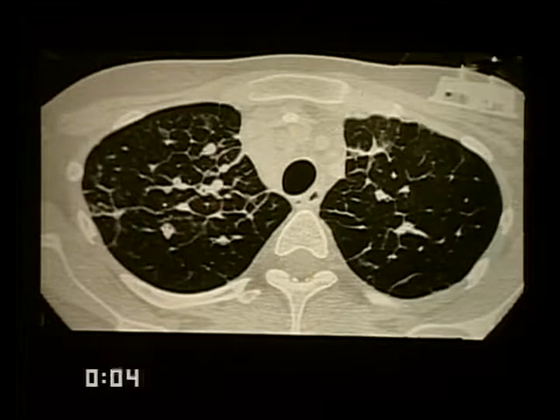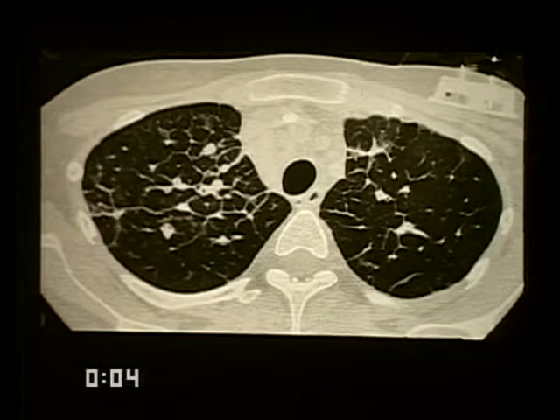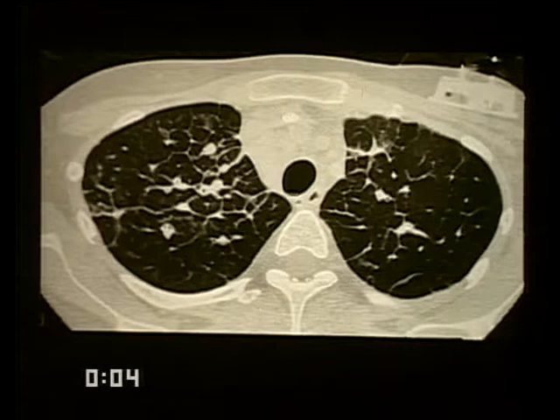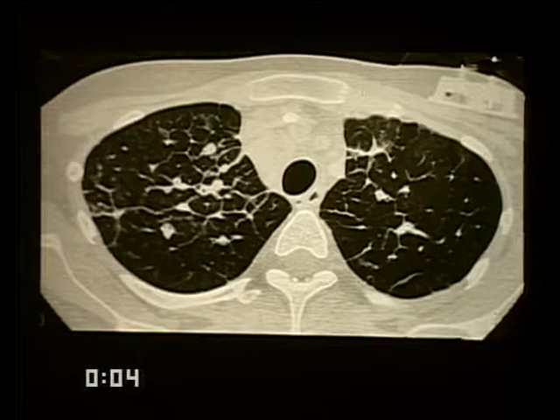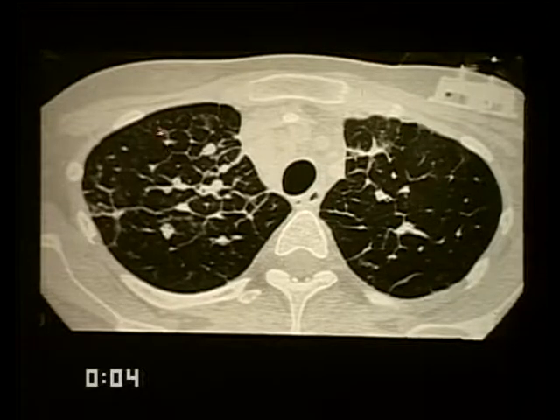The wall is thick, and the central dot in the middle is composed of either the arteriole or the bronchiole, and if it is visible, it is pathologically thickened. It is often thickened, for example, in conditions that block bronchioles, and it may be thickened in conditions that involve the lymphatics. When one looks at the periphery of the lung, it is possible to see small curly type lines, and one can see another one, for example, here.